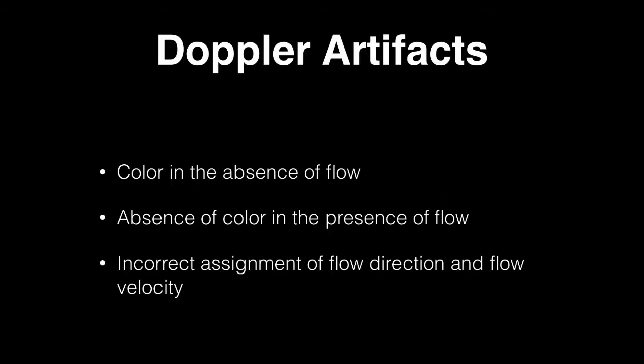So let's start from the beginning and go through image acquisition and image optimization, and along the way we'll discuss some of the physics principles that pertain to each of these settings. I just want to emphasize that it's really important to both correctly acquire and optimize the image, because failure to do so could lead to the presence of Doppler artifacts that could result in incorrect clinical interpretations. You may end up with color in the absence of true flow.